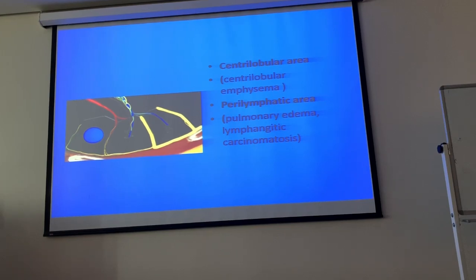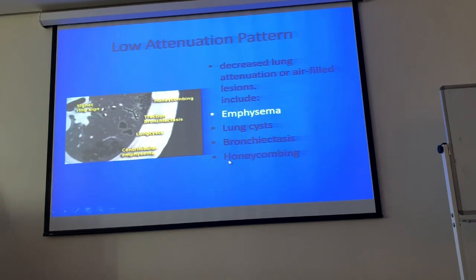So centrilobular will usually be in the upper, and panlobular will be in the lower lobe. Absolutely. So if it is along the septa, with destruction of the architecture, and the disease is along the septa or along the pleural line, thoracic pleura, or along the diaphragm, that will be called paraseptal emphysema. I will show you in a while a schematic drawing which explains it.